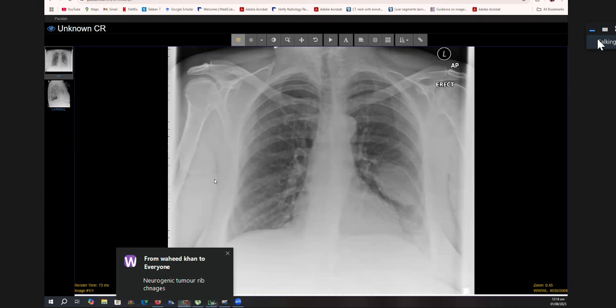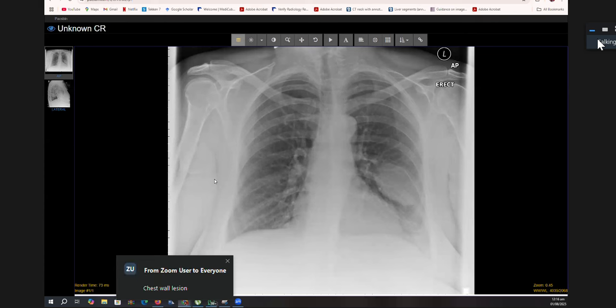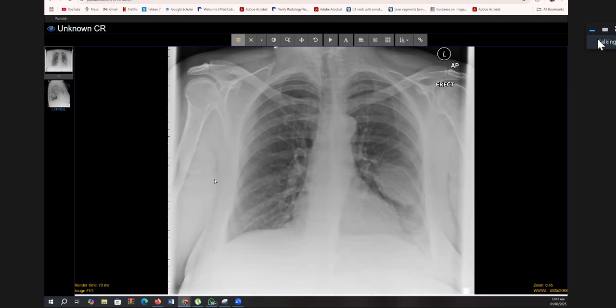Well, is the lesion between the rib and the mediastinum? It's not in the mediastinum, is it? What do you think about the rib? Sir, what three structures live in the intercostal groove? Artery, nerve, vein. Which of the three do you think this is? So this is nerve. So what's the diagnosis? A neurogenic tumor, schwannoma, neurofibroma. Yeah, it's a schwannoma, isn't it?